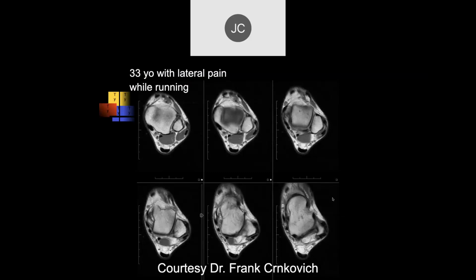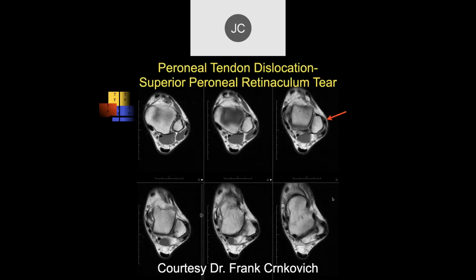I guess we're beating a dead horse here. It's again the anterior dislocation. Okay, so we see the tendons. Dislocation of both of the tendons laterally. I mean, I said retinacular tear anterior. Good. Anterior lateral.